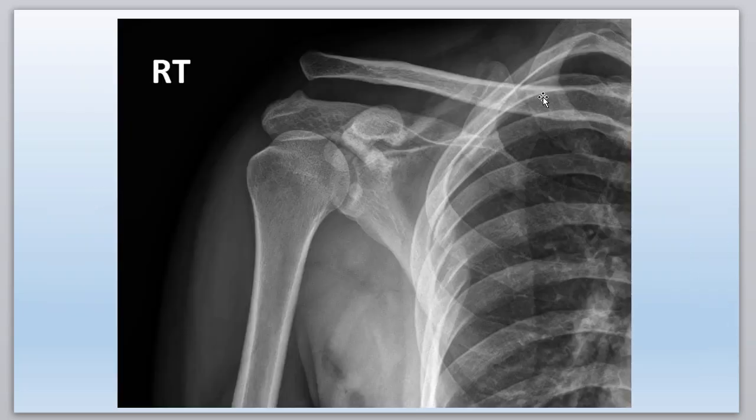Let me give you a second, maybe pause the video right here. Take a look at this, see what you have, see what you can see. Pretend this is your 4 o'clock patient. You just finished the history, the examination, did your x-ray. Patient fell on her shoulder in a weird way. Severe pain. Didn't want to go to the ER, wanted to see you first. So what do you think? Alright, let's look at some orientation here. We got a lot going on here. She probably wouldn't come to you. She'd probably go to the ER, but you never know.